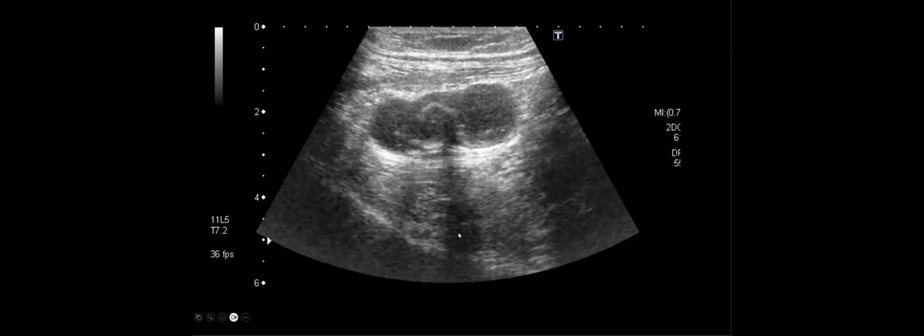So this is a middle-aged woman and she complains of pain in right lower quadrant. Ultrasound is done. That's the appendix. And we see two protrusions out of appendix. It wasn't very clear whether they were cystic or mass-like. So MR is done.